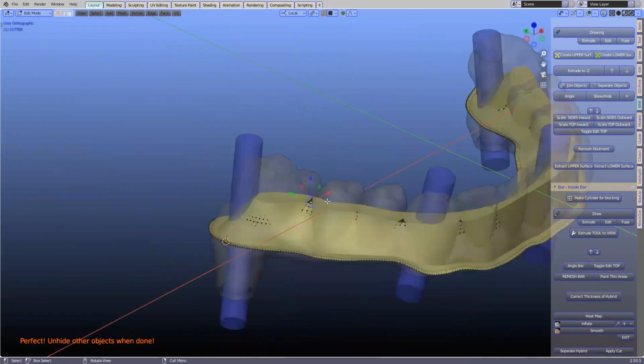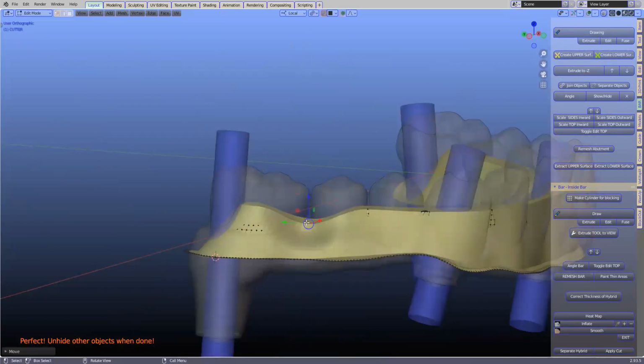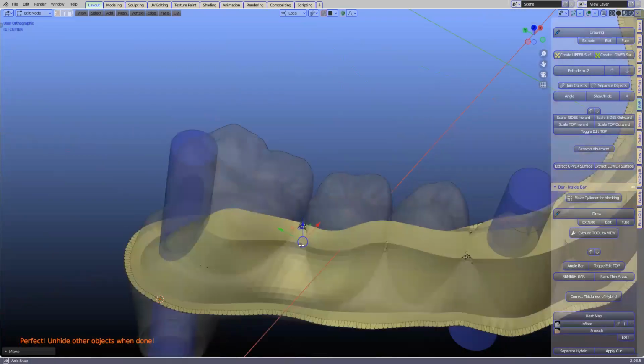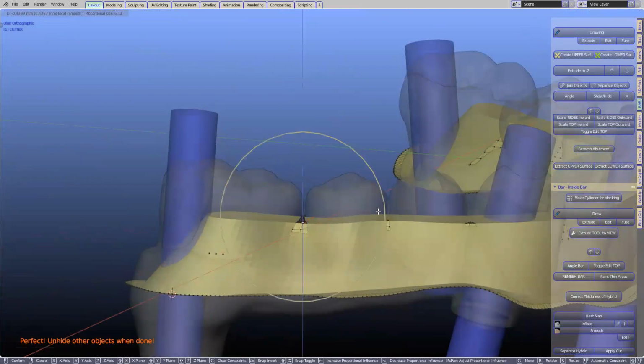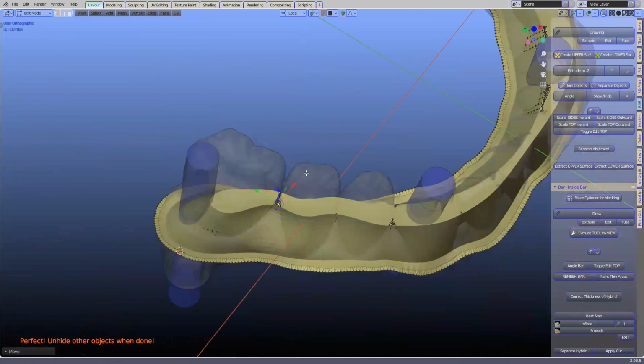Here, what we can do is GZ. We can bring that all the way down. You can see there's a hole between those two. But we can fill that hole. So let's just keep it like that. So it's a bit of a funky looking shape bar.